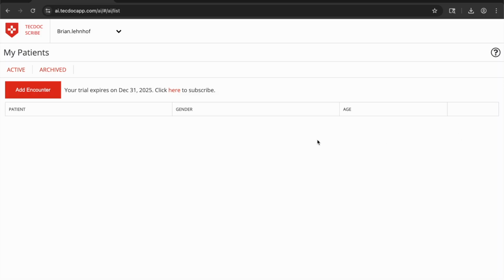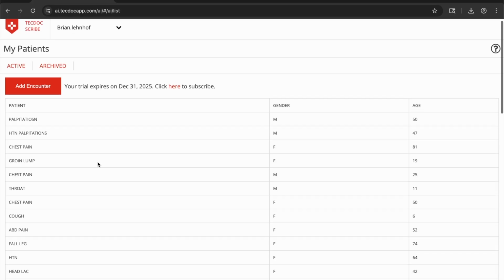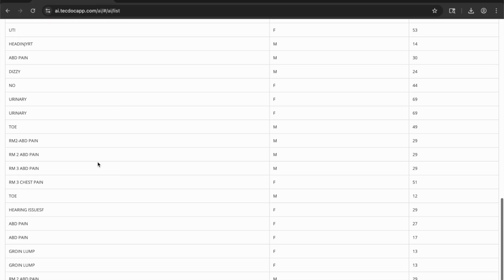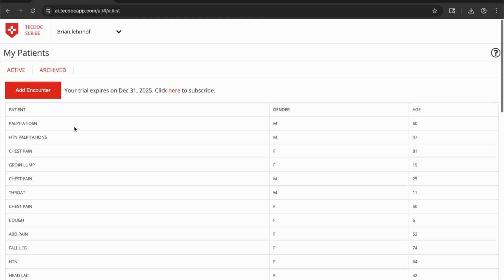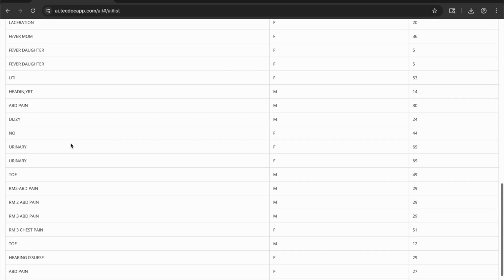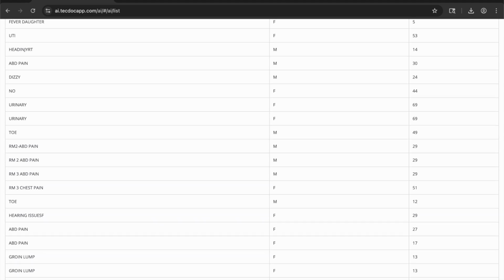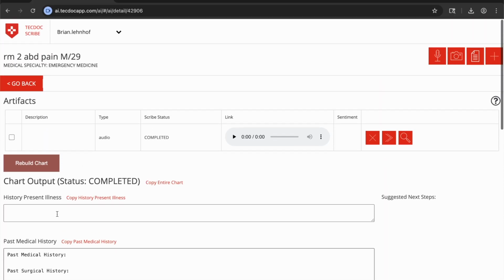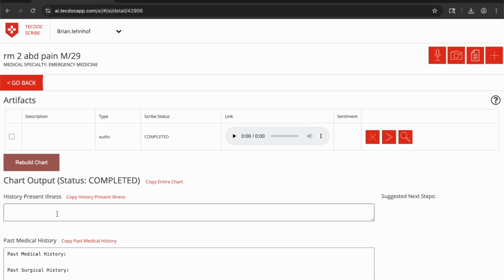it'll go into the archive folder. If you need to get into the note that you archived either prematurely or accidentally, you can always go to the archived section. In this section, you'll have access to all the notes that you've done recently. So if you need to get back into them, you can go in, you can copy from these, you can still get all the data that's there. This one doesn't have much in it, but you could click on this and it would have all the recordings from what you did. After a few days, the archive folder gets automatically cleared out and erased, so these transcriptions are not staying in there permanently.